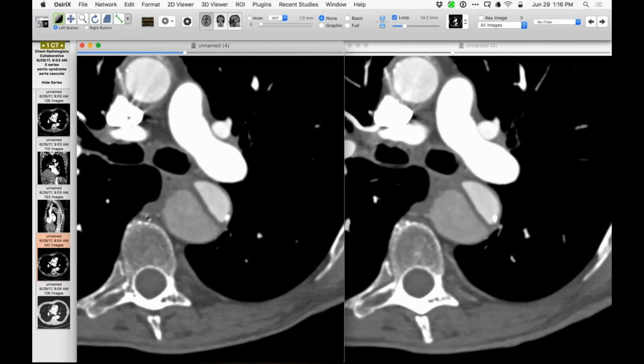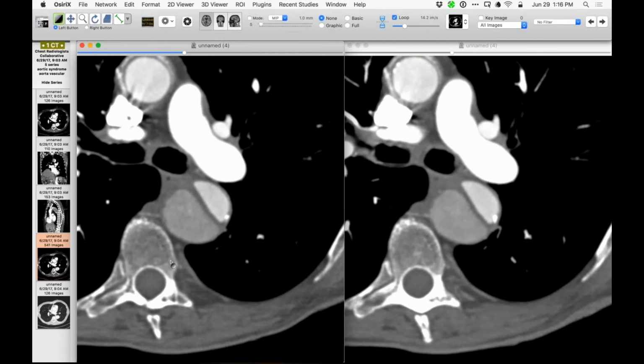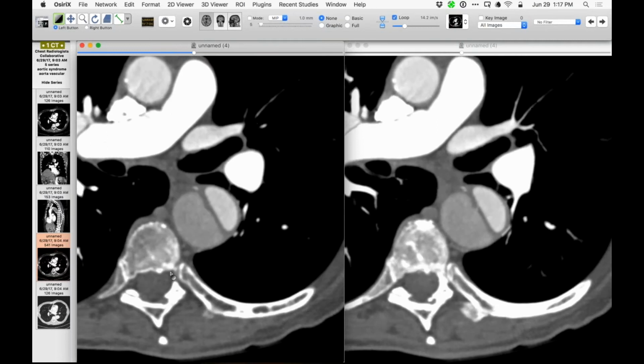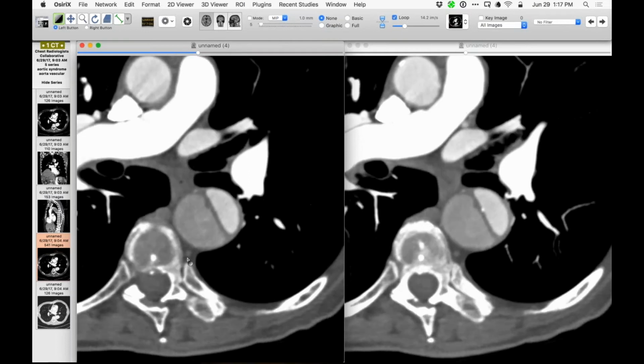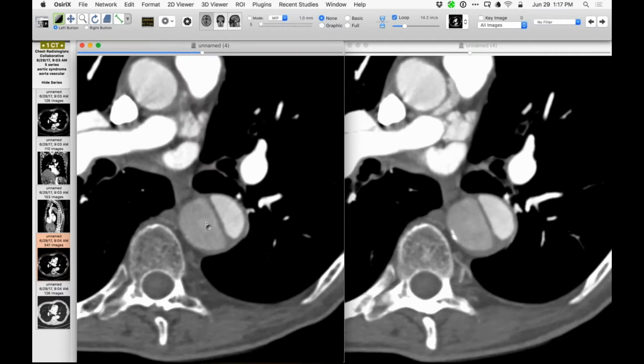Well, in some cases, the intercostals come off here from the false lumen, right? Sorry, I think I heard maybe David making a comment. No, that was actually Art Tillman. He was saying that that's where they originally were, opposed to the intima, so that when the intima is pulled away, yeah, well, could be there. When it's pulled away, it's where the intercostals would come off.